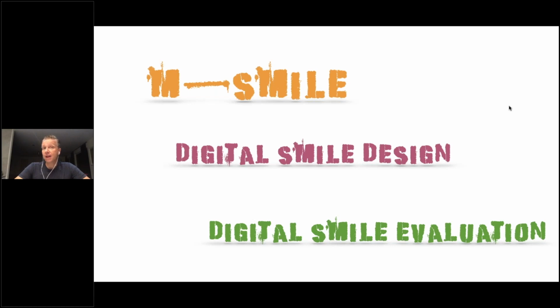Usually I call it a digital smile evaluation, and I'm utilizing the M-Smile module. Why do I use the M-Smile module? Because it allows me to transfer a 2D image and 3D models and converge these two things together. On one side, I can create a beautiful two-dimensional smile design for our patient and our customer to show what maybe is possible, but at the same time I already have a diagnostic cast digitally, and I can create that smile in a three-dimensional form to then print the model and start with the treatment.